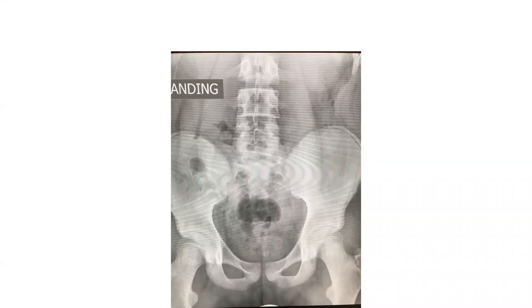So there's a lot we can take from this, okay? But when I first see this and I say, Peter, I think I mean PJ, describe this to me, okay? You're gonna say this is an AP pelvis, right? Anterior to posterior of a skeletally immature patient, right? Can you tell it's male or female? No, you can't, okay? Can you tell anything important about it?